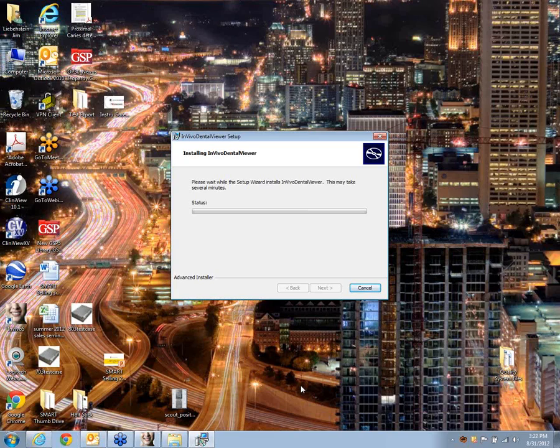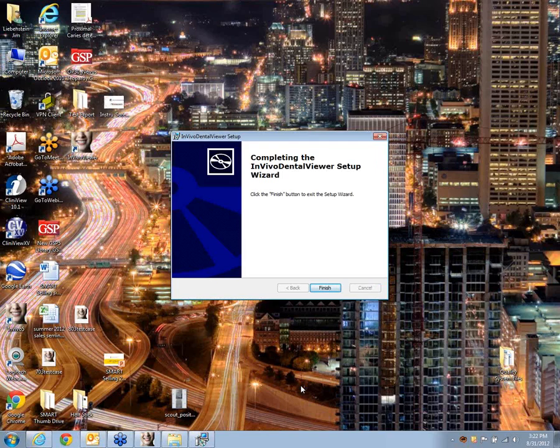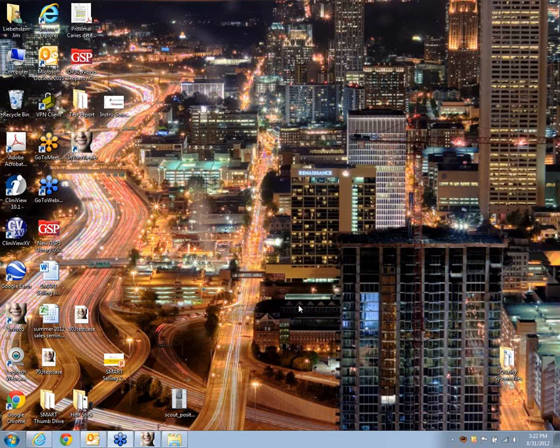While this is installing, I need to tell you that Anonymize is just finalizing another version of InVivo Dental. If your purchase of our equipment has taken place within the last year, you'll be eligible to get this update free of charge. If you've had your system longer than a year, talk to your Instrumentarium and Soredex sales representative about the possibility of getting the latest and greatest, which is InVivo Dental 5.2. InVivo Dental 5.2 has the provisions on board for making a freeware file viewer, a free-running demonstration that allows you not to have to jump through this particular hoop to package your case with a freeware viewer.